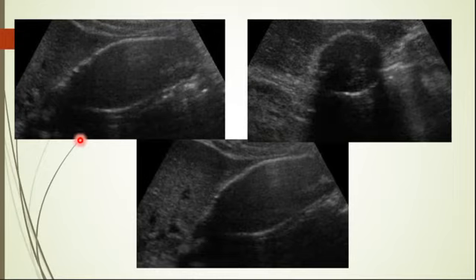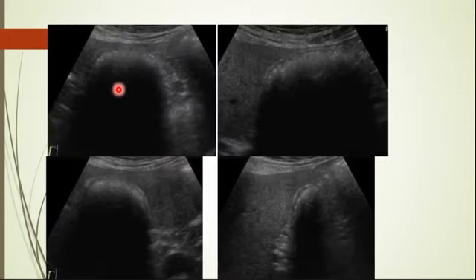The entire gallbladder wall is calcified, and here we don't see what's called the wall-echo-shadow sign. We should see what's called the wall, then echo, then shadow. This is a gallbladder, while here we just see a calcification, no echo and no shadow. This is a porcelain gallbladder, while here you can see there is a wall, then echo, then shadow. This is a large stone completely filling the gallbladder, not a porcelain gallbladder. So this we should be careful about.